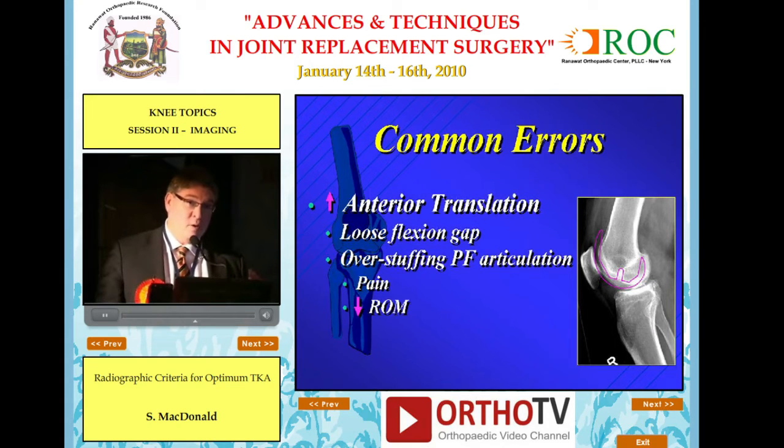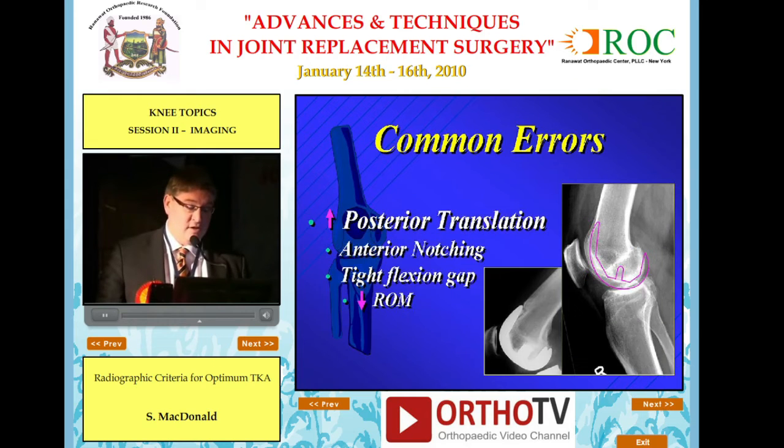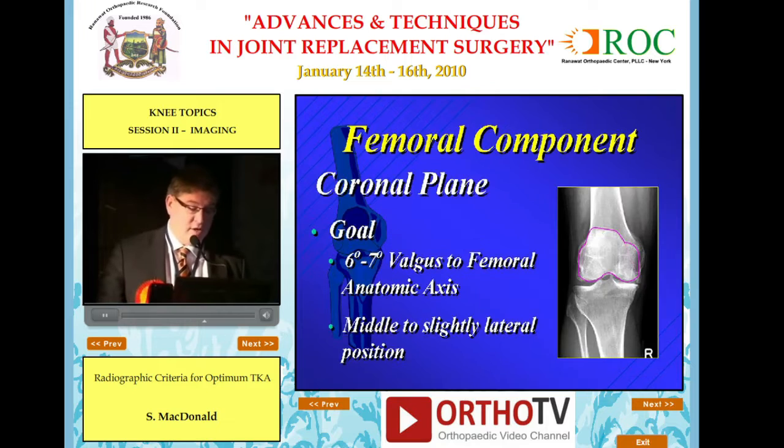Anteriorly translating the component occasionally occurs by the surgeon trying to avoid notching it, but if you exaggerate that, you can overstuff the patellofemoral articulation. I think that's a real entity, and that can create pain and decrease range of motion, in this case flexion. I think notching we've all been aware of. Interestingly enough, small notches I don't think create a significant problem. A significant notch obviously looks terrible radiographically, but if you overdo it, you can create a tight flexion gap if you're not subsequently balancing that knee, and decrease range of motion.